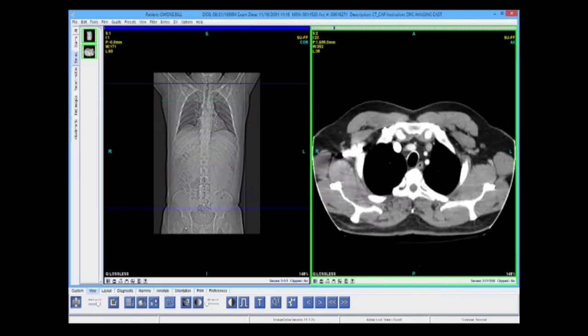The cross-reference tool is available on the View toolbar tab. It can be placed on the shortcut custom toolbar by selecting a right-click that will toggle through the different steps of the cross-reference lines, or it can be selected by just simply selecting the X key on the keyboard.